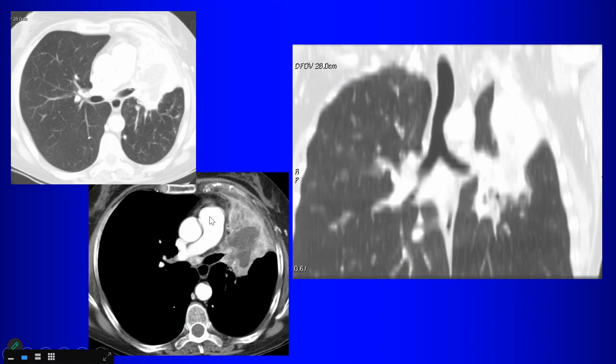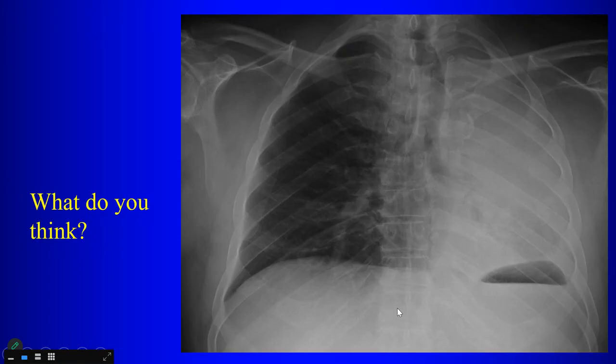So this patient has a big nasty tumor. Here you go, here's your nice example of low attenuation within the tumor. What kind of tumor is this? Squamous cell, right. This is another squamous cell cancer causing obstruction of the left upper lobe bronchus. And then here we have our compensatory hyperinflation from the superior segment of the left lower lobe, giving you the luftsichel sign.